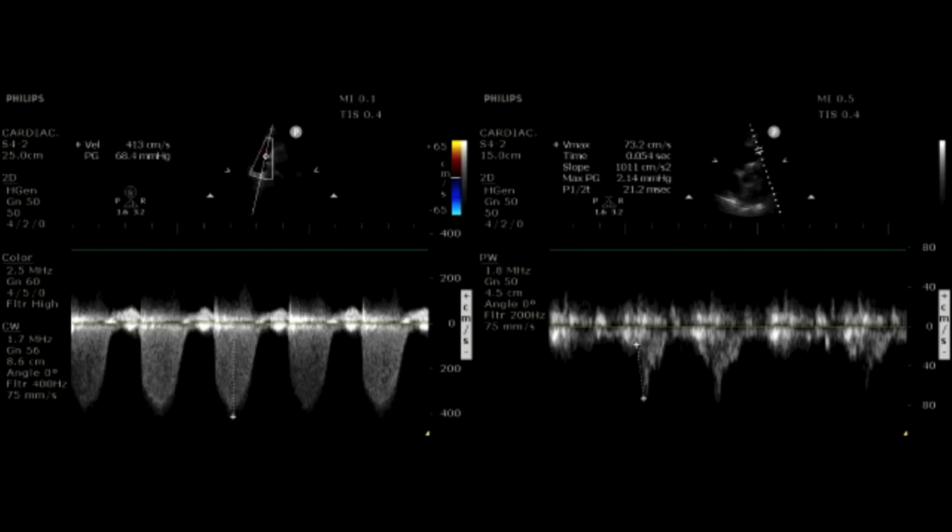Yeah, so what happens is in a normal individual, I wish we had an image of a normal pulmonary artery pulse wave Doppler. What you would see is the descending limb, which is being measured for time here, going down much more gradually, okay? So you would see an acceleration time usually exceeding 120 milliseconds. So you go all the way to the baseline and you measure the tip of when the velocity actually peaks, okay?